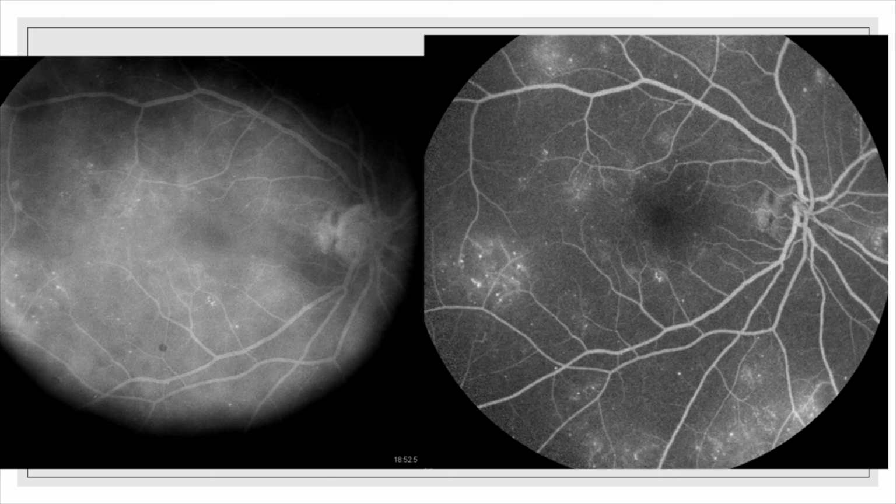And you can see the images on the right and the left. What's special about this case is that the patient underwent the FA on both the Spectralis and the FF450. On the right hand side, you see the Spectralis image. You can clearly delineate the MAs, and the vasculature is also well defined. And on the right side also, you can see these MAs. With a little playing of the contrast, you can pretty much visualize a lot of things there also.